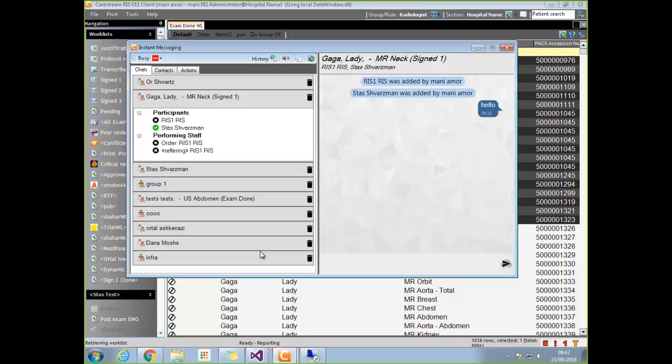One very small comment: in most chat and messaging applications, if you start a one-time group, you don't have to name it. The name is created by all the people participating in it. This is a very small thing. Yeah, that's been a little back and forth. Originally, it started as all of the people, and then it was changed. Sometimes, most of the time, it's good to put a name. But if you want 2 or 3 people to discuss one topic, put a name and then delete it. So maybe make the name optional. Yeah, but it's very small. Yeah.